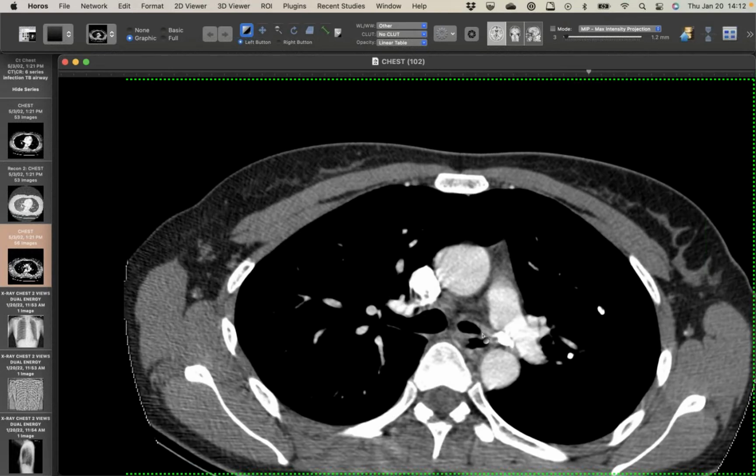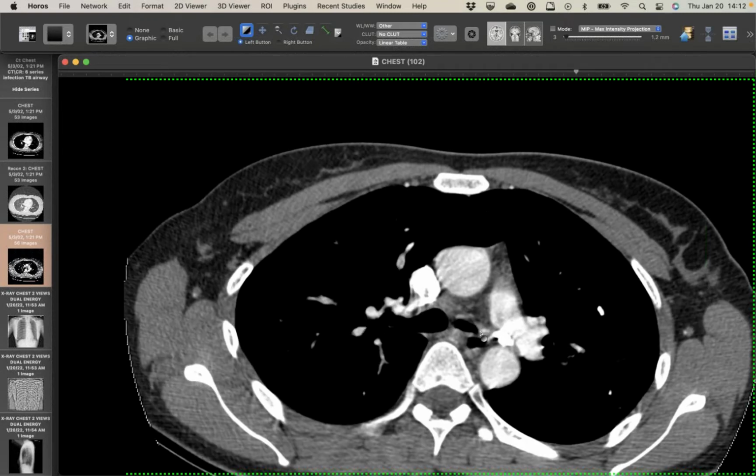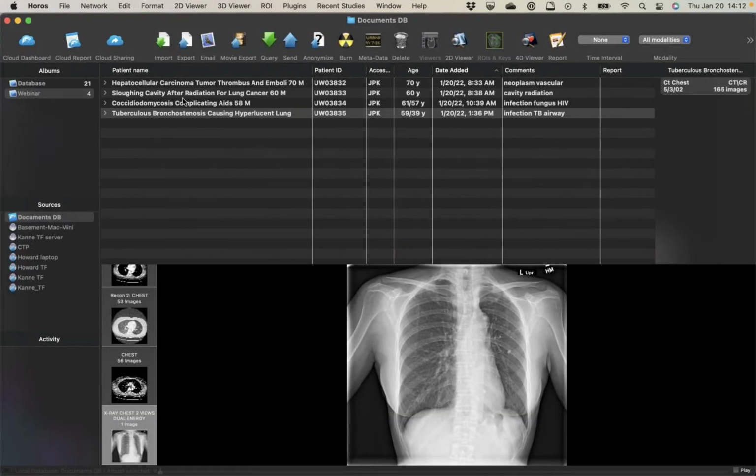They did some thin cuts, but they had to do step and shoot for them, so we don't see the full volume, but you can see that narrowing. But there's also some thickening of the wall. So this is long-standing bronchostenosis from TB, but it's a great teaching case for physiology and observing differences in lung attenuation, caliber, vessel size, and volume. Yeah, then very good.